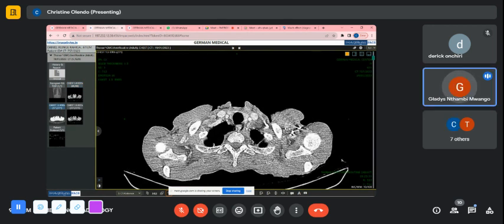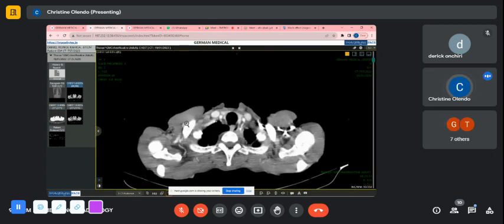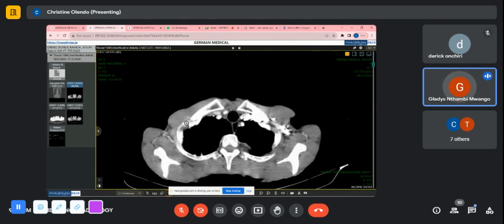Yeah, there is a focal pleural thickening which does not enhance. All right. And it's better seen, really, not on this window. Yeah. In this other window, whereby, if you look at it, it could look like fat. Yes. Because you can look at it, it has the same density, just eyeballing it, as on the contralateral side.